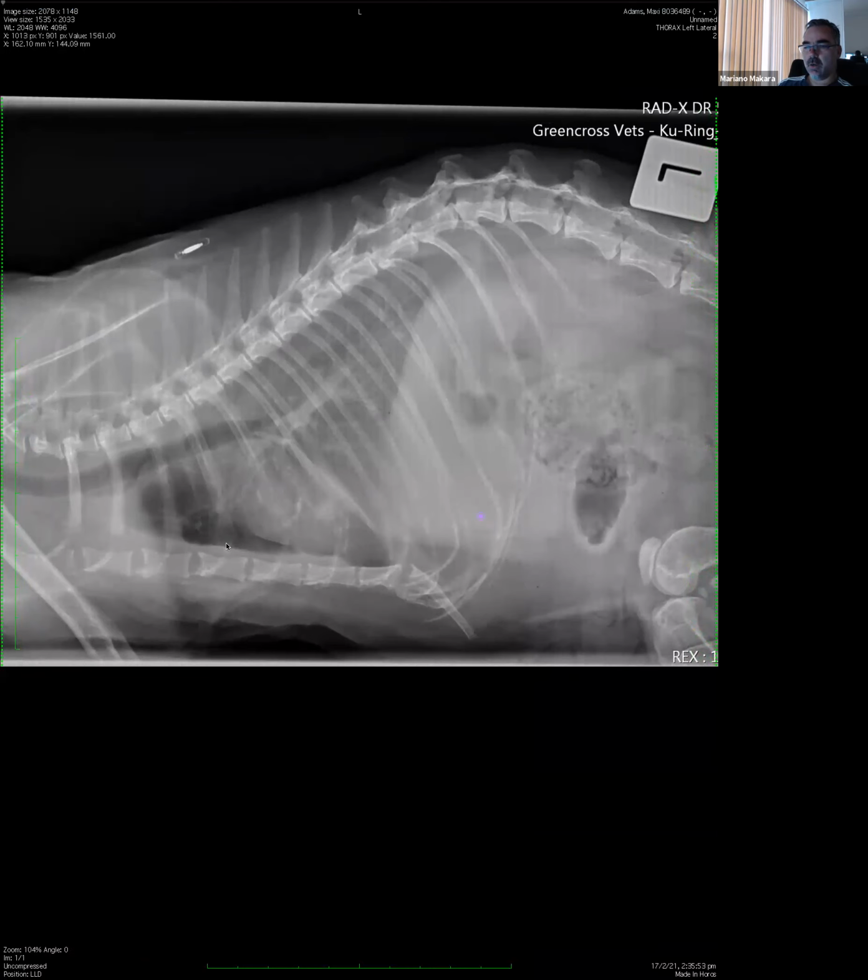Where is that? Okay, take your cursor to the right, up a bit and about there. No, not so far. Down, down, left, left, there. Okay, good. Anyone willing to offer an explanation for that? And I agree with you, it's there.